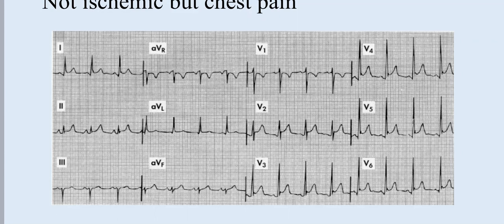Here, by the way, you are both right. That's why I stressed the clinical scenario. If I have a patient like this who presented with chest pain and I see this ECG, I will be inclined towards something like pericarditis rather than early repolarization. But early repolarization and pericarditis look so much alike.